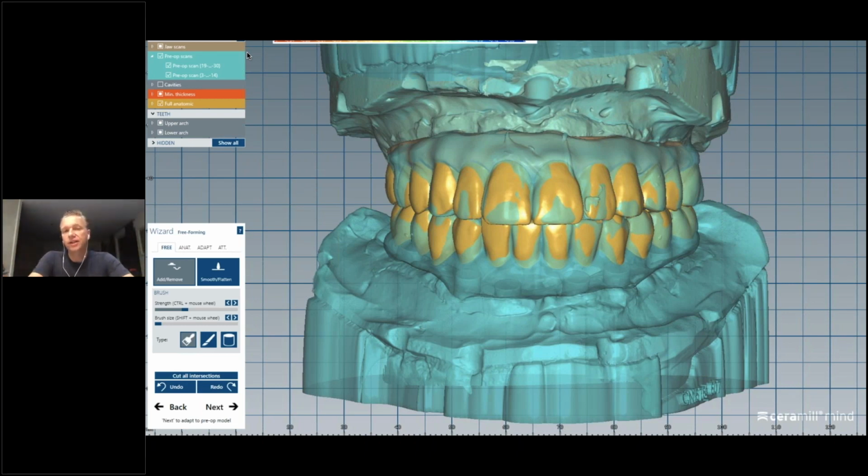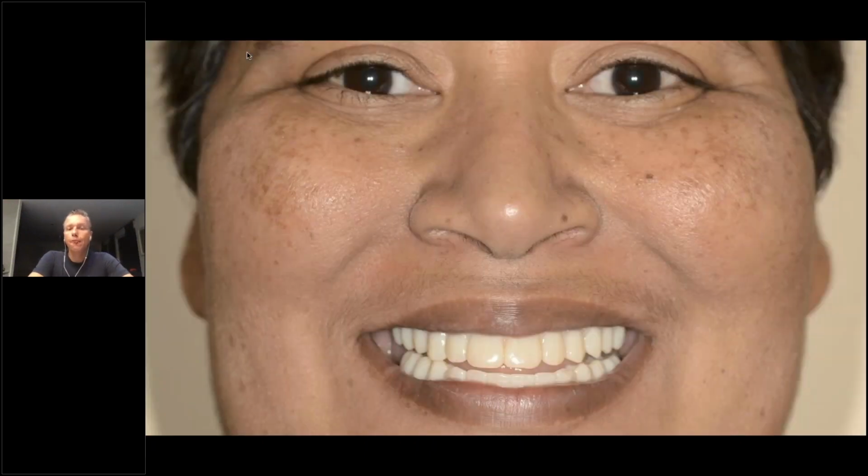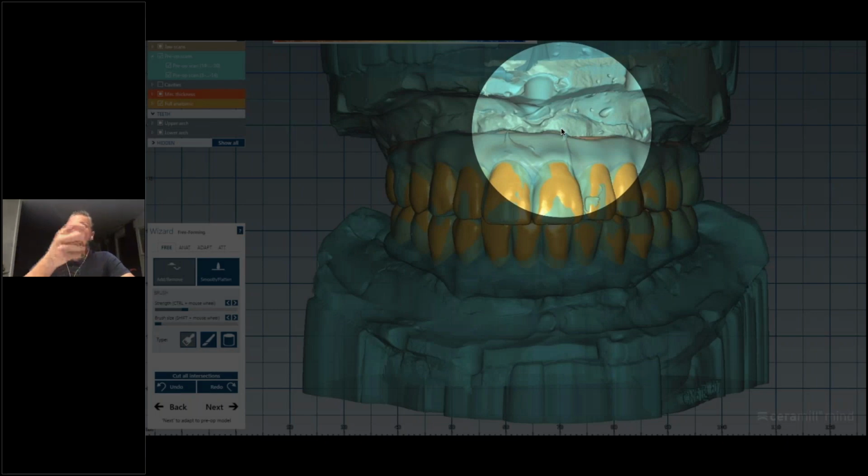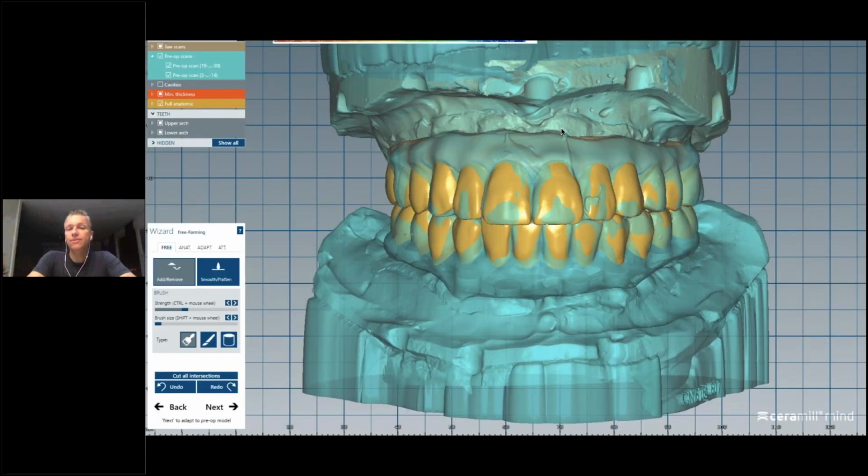So what he usually does, he actually tries in that prototype. He sends the patient home, uses it as a temporary, adjusting occlusion, function, aesthetics, etc. Then after a week or sometimes 2 or 3 weeks, the patient comes back. The doctor takes out that temporary, screws it on my master cast, what you see here, where we have some landmarks ground in basically, and then he's scanning it with his Trio scanner and sends me that file, because he likes to keep this in the mouth, and then he puts it back into the patient's mouth.